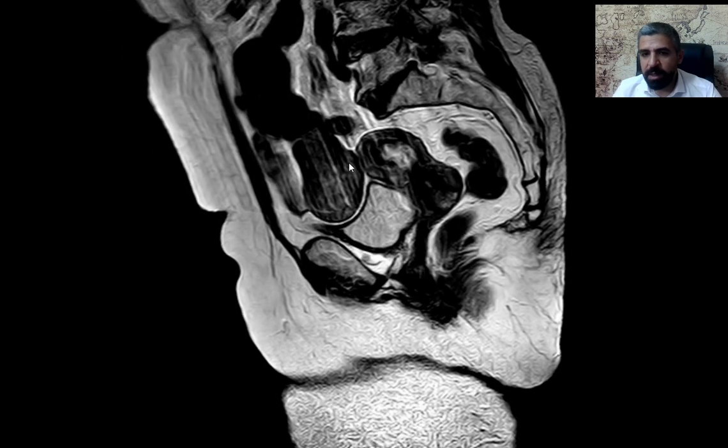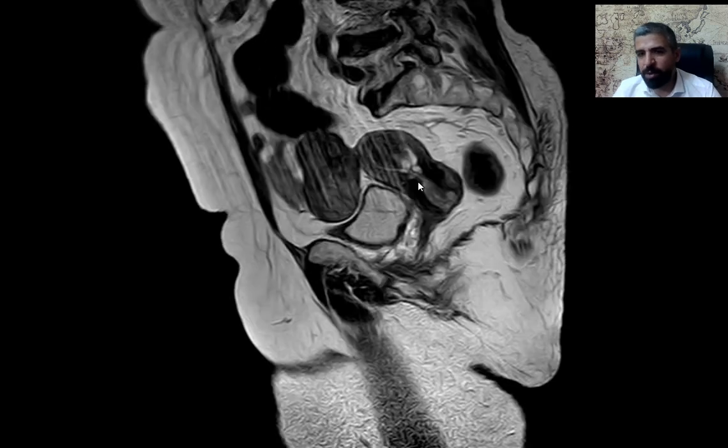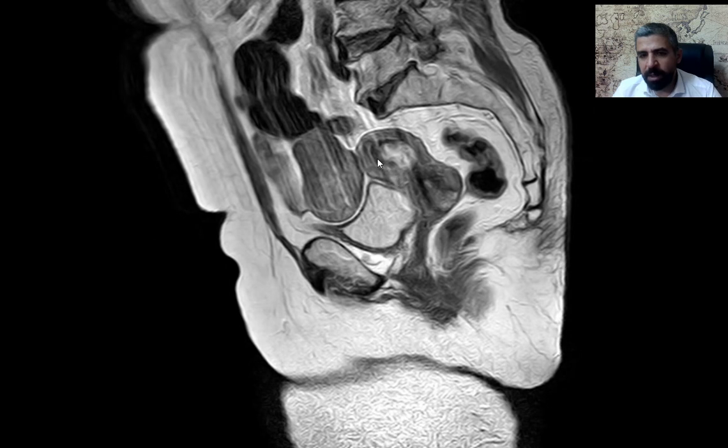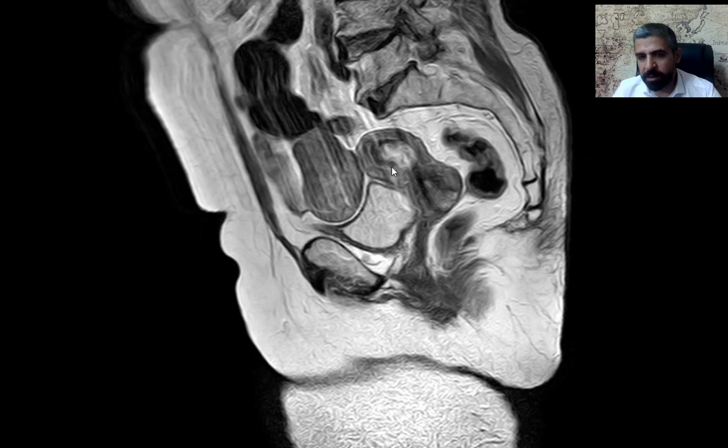And you can see, surprisingly, that this endometrium is prominent. In a 93 years old patient, the endometrium should be very thin, like 1, maybe 2 millimeter, no more. And the more interesting thing is you can see this is the junctional zone here, and here it is interrupted. The junctional zone here is not seen, it's interrupted. So what does that mean? Even anteriorly, it's a little bit interrupted.